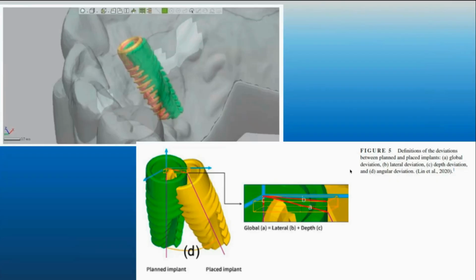So from a quality control perspective, we make sure the guide sits on the model that we've replicated or been utilizing. You still need to do a trial of that surgical template before surgery. Make sure everything seats, and we'll give you windows to verify that it's seated. But it's really important, because if that surgical template isn't fitting on the teeth, then we're not going to be able to predict the delivery of the implant. And in some of these cases where we're dealing with a 3 millimeter diameter implant, we're right beside tooth roots, so that's why we want to make sure that that's predictable.